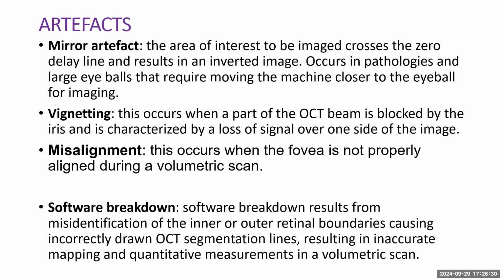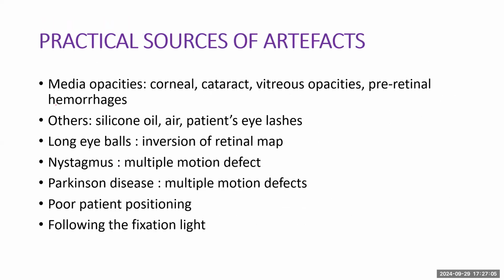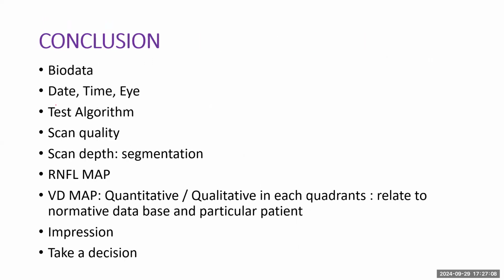The other part is the source of artifacts. We've talked about this before, it is the same as for OCT. Actually, for OCTA, one of the drawbacks is that the patient has to be dilated and has to be still, because the scan is a deeper scan and the signal strength makes it hard to get good quality in a patient that is uncooperative. Other things that could happen with OCT apply here as well: misalignment, vignetting, software breakdown, artifacts from blink, segmentation errors, opacities, and all.